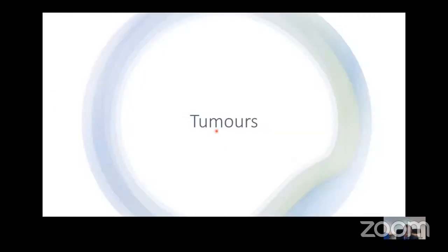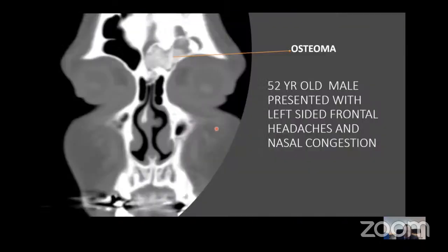Moving on to the last section, which is on tumors. As we all know, tumors can be benign or malignant. Here is a patient with a left-sided headache, discomfort, and nasal congestion. We can see a bony lesion filling the left frontal sinus and extending quite significantly laterally as well. From the ENT surgeon's point of view, if this patient is symptomatic, as we can see, it requires surgical removal of the osteoma.